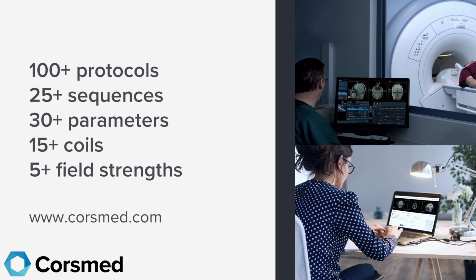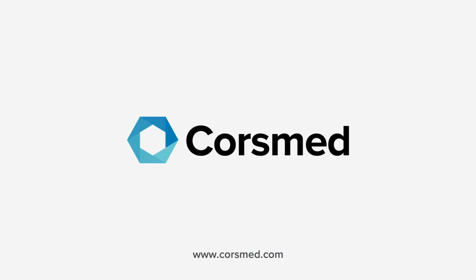And this is all possible because we create every single image from scratch using the same MRI physics as a real scanner. So by using Corsmed, it's like you have a real MRI scanner on your laptop, but that is instantly available whenever you need it, and that is only 1% of the cost of what it would take to run a real MRI.